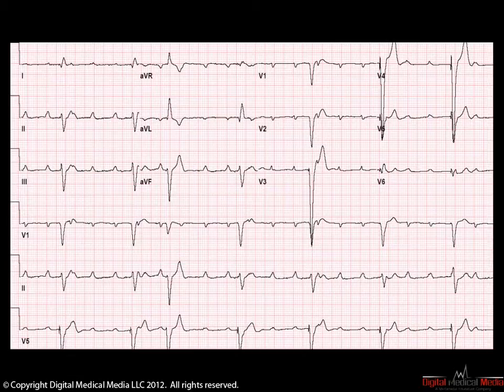In addition, you should be able to see that every QRS on this 12-lead ECG, with the exception of the third beat, is being driven by a ventricular pacemaker. Again, the ventricular pacing spikes are not overtly obvious on every lead of the ECG in front of us. However, lead V5, which is seen in its normal location in the precordial leads, but also across the bottom in the rhythm strip, clearly has a ventricular pacing spike in front of each and every QRS, with the exception of the one early beat, which is in the third position.